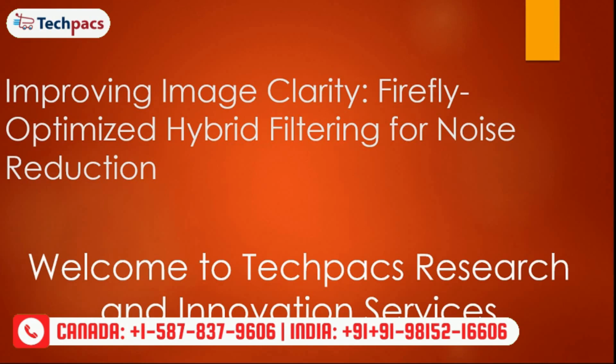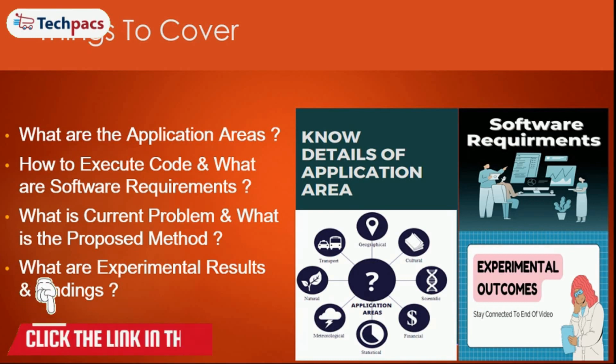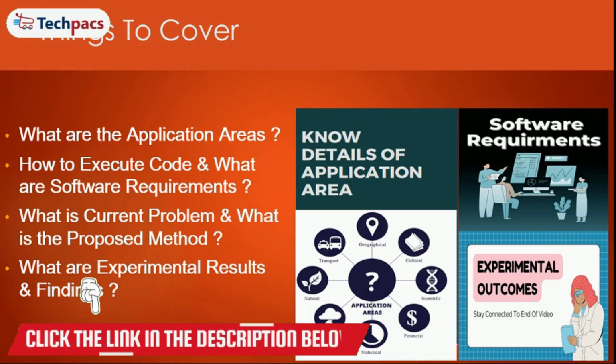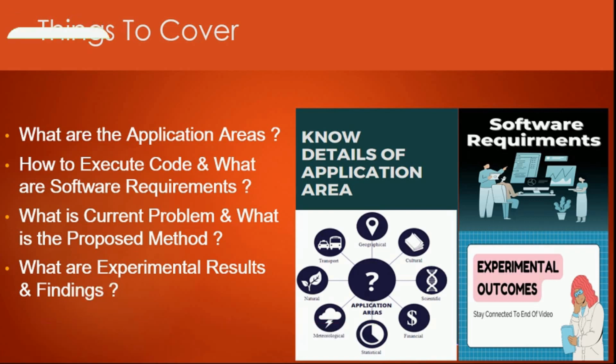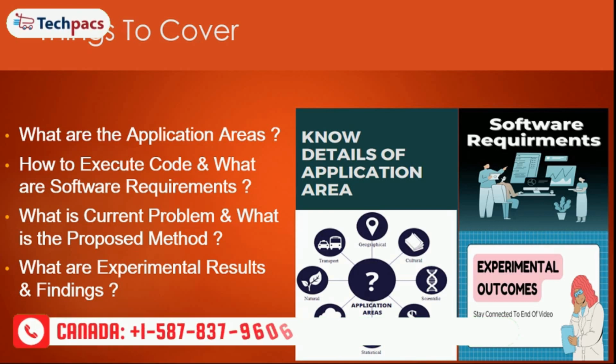Before moving to the video, let's talk about what we will cover in it. We will initially talk about the application areas where the developed system can be used, followed by the code that we have designed, how to execute it, what files you require, and the software requirements for it. Then we will talk about the current systems that are working in the same domain, and the problems identified in them, and what exactly we have developed for that. Finally, the experimental outcome and findings will be discussed.